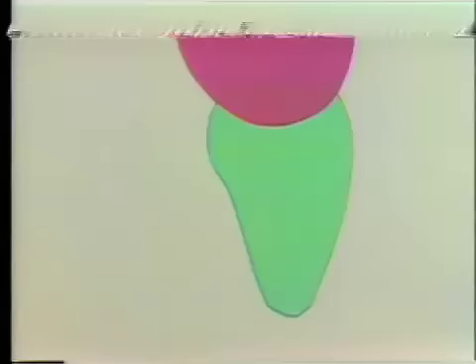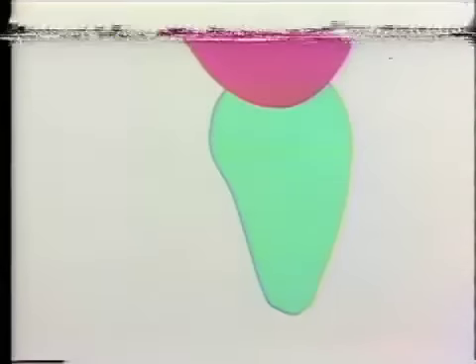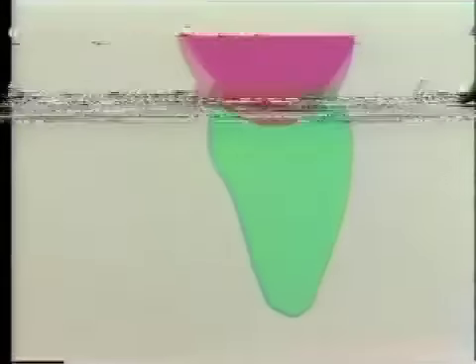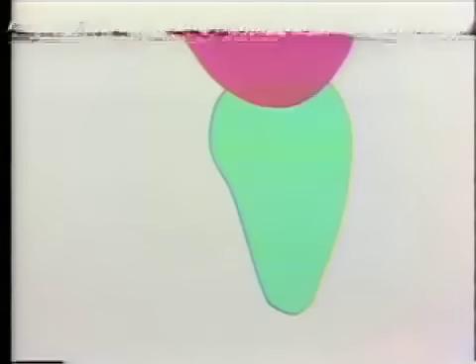of the screen. Following the extraction of this tooth, as you realize, of course, the alveolus will shrink away, as you saw in that dissolve, back again now to the normal relationship of the natural tissue, and then as that fades away. Now you can see that if you were to just project the lingual and labial surfaces of the natural tooth form to meet the new position of the alveolus in a Pontic, that the Pontic would be somewhat longer than the natural tooth. Certain modifications are made to deal with this situation.